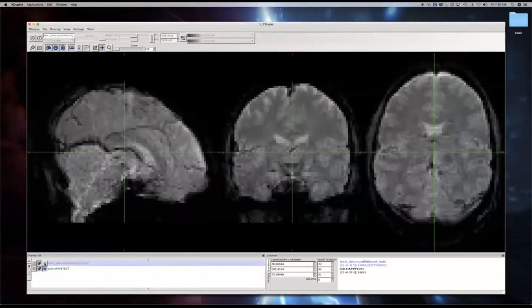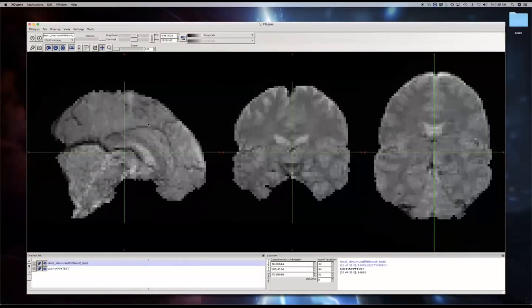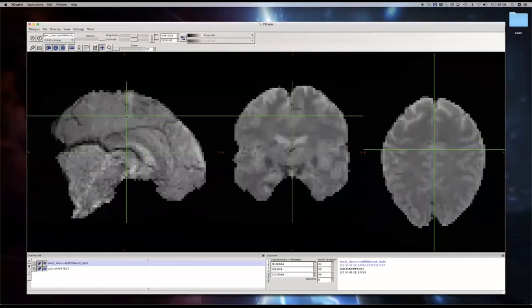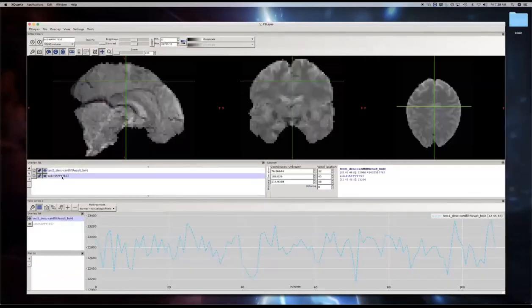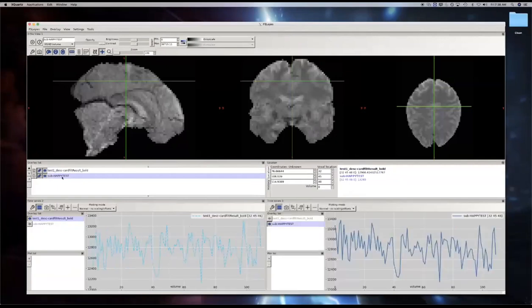We can also choose a voxel and use Ctrl+3 or view time series to actually look at the time course. So this is now from our new signal in here, and this is the one from the original data. You see small differences besides that one is detrended. For example, in the last peak you see a small reduction, but it's very hard to see just looking at it like this. It is better to look at a variance map or variance reduced map to look at the differences.